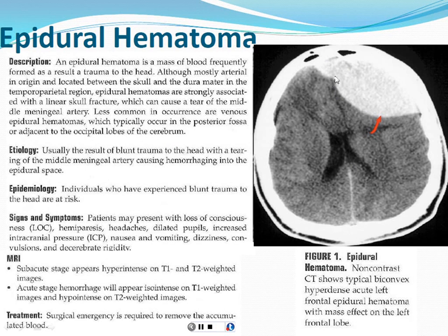This is something you would rarely diagnose on MRI because usually these patients come in with really major symptoms, maybe lost consciousness, had trauma. They often have a fracture of the skull and have damaged one of the epidural vessels here. And because it's an arterial bleed, it creates a lot of blood in a small space in a small amount of time. So this is a major surgical emergency.